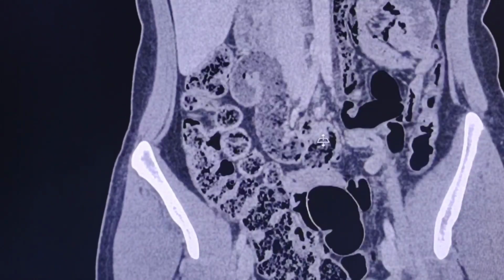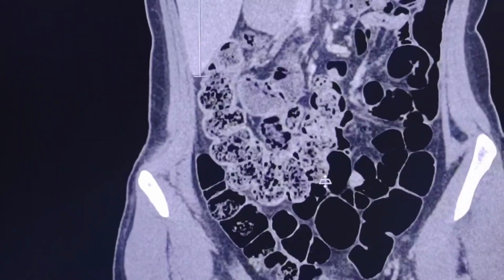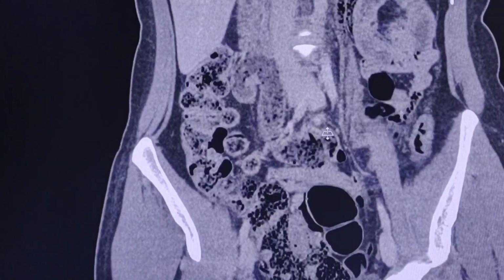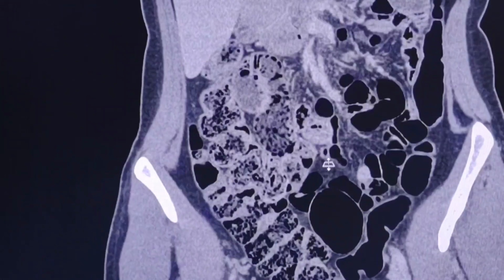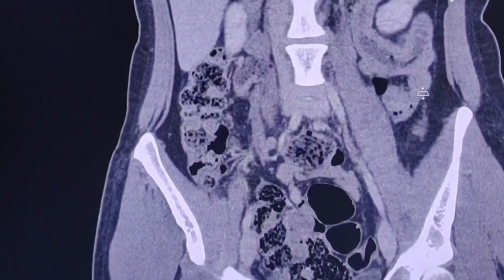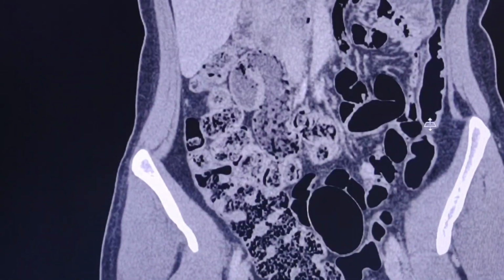So the above findings are suggestive of reduced small bowel outflow, and the findings could be associated with underlying small intestine bacterial overgrowth, or SIBO, S-I-B-O. However, in this patient, other underlying pathology cannot be definitely excluded, and we can discuss the differential diagnosis a little later. Now, as for the SIBO, small intestine bacterial overgrowth.